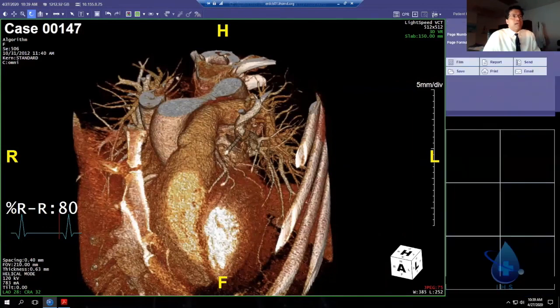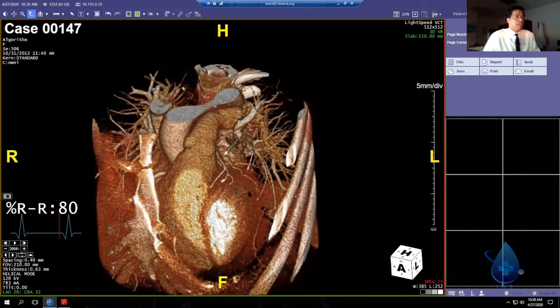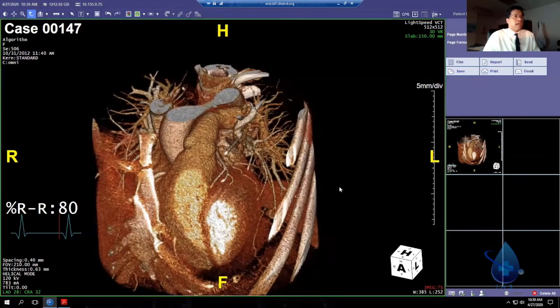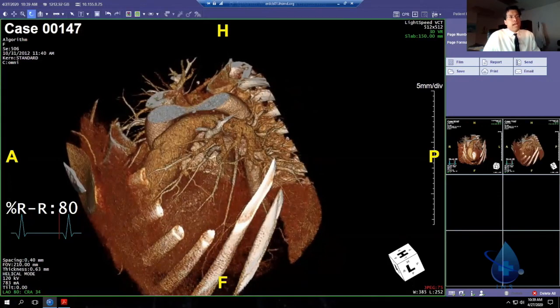There's an output panel, which you're not going to need this week because you're not actually reporting. But if I was reporting, let's say I wanted to capture this picture, I click this camera button and it basically captures that picture to the Windows clipboard and captures it into the output panel if you want to add that to the report. But since you guys are not actually making reports this week, except on pieces of paper at home, you're not going to need this output panel this week.